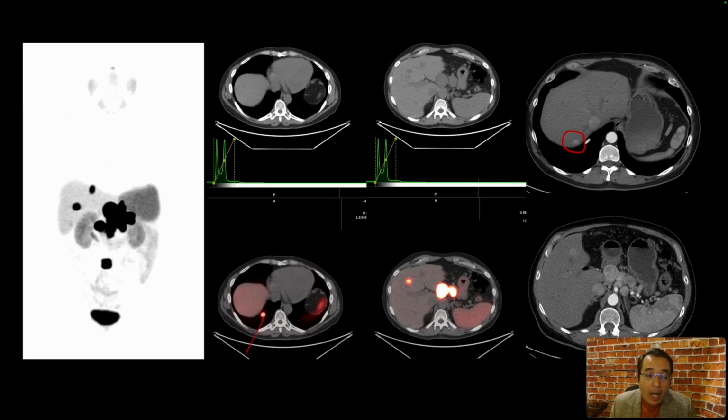And so the diaphragm is the site where misregistration is frequent, and that is because the CT part of the PET-CT is acquired with a breath hold, and usually it's in a state of inspiration, but the PET in that bed position is averaged over several respirations. In a particular bed position, we acquire for about 3 to 4 minutes, and in these 3 to 4 minutes, all the breaths are averaged.